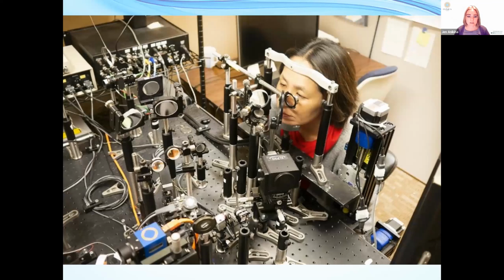And this is an adaptive optics SLO machine. And I've worked on something very similar to this. In fact, this might be the very one I worked with at UCL. So it looks very far from clinical practice yet, but I think it should come because it gives you pictures like this. And this is in vivo, so real-time pictures of real rod and cone cells in the retina, comparing density. So the picture in the bottom right, that's a normal fovea.